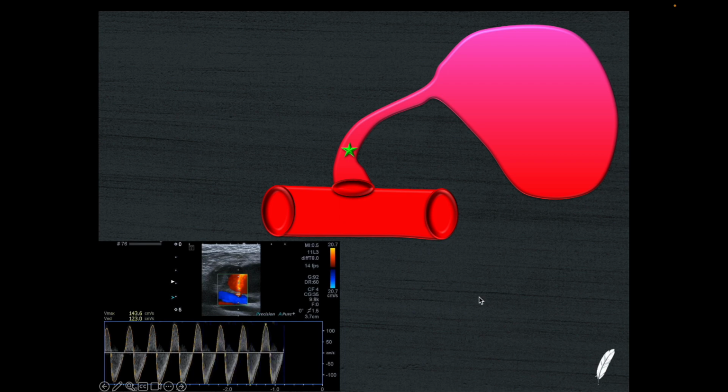Now this is the only type of circulation that can have a balanced amount of inflow and outflow in systole and then diastole respectively, because there is nowhere else for the blood to go. It's a closed circuit. There's no venous outlet from this, so whatever goes in has to come out, and this proves once and for all that this is indeed a false aneurysm.